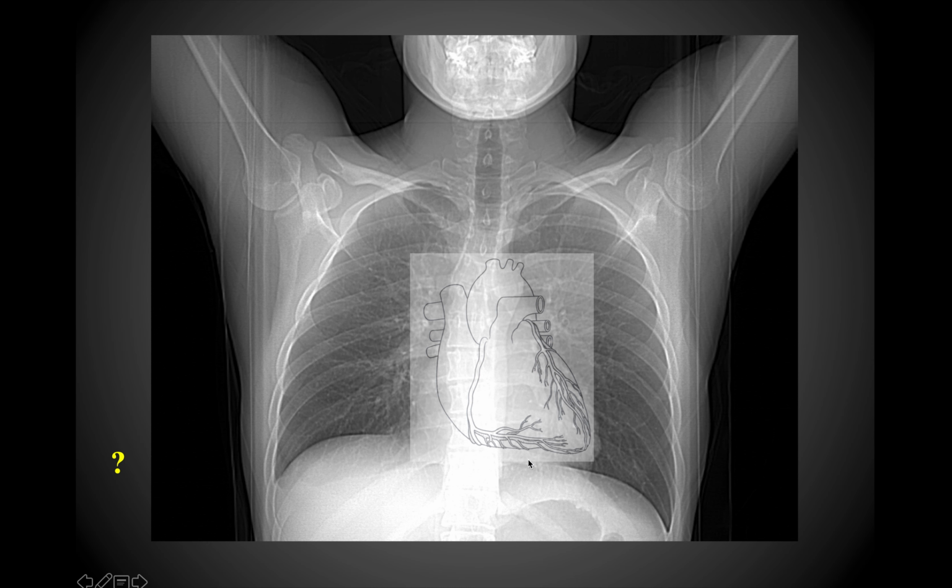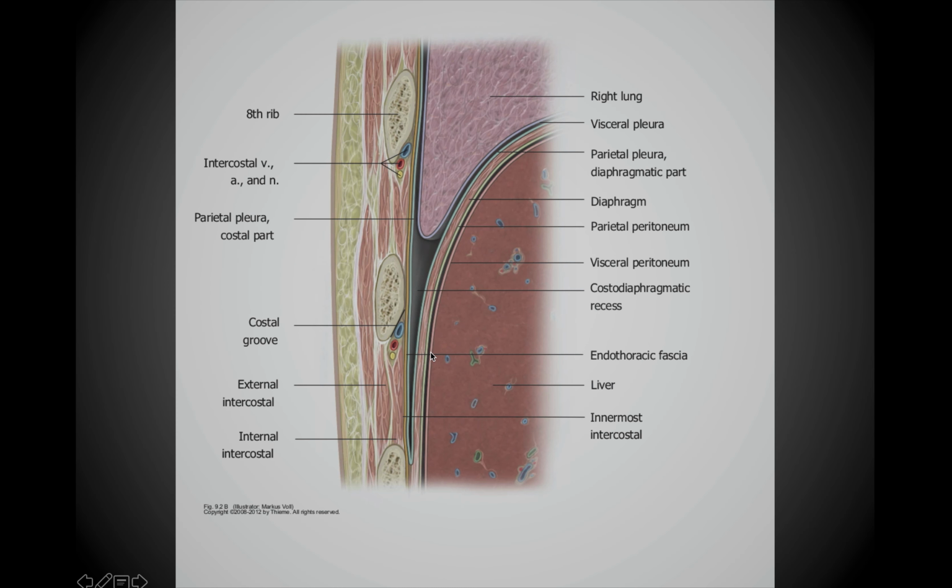And so the majority of the anterior surface of the heart that you're seeing on a PA or an AP X-ray is going to be the right ventricle. And then obviously the aorta coming up and over off of that, the pulmonary trunk branching off and giving off the right and left pulmonary arteries, and the pulmonary veins right below that.